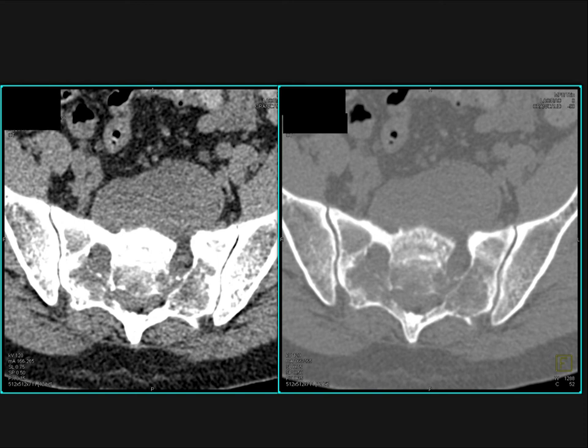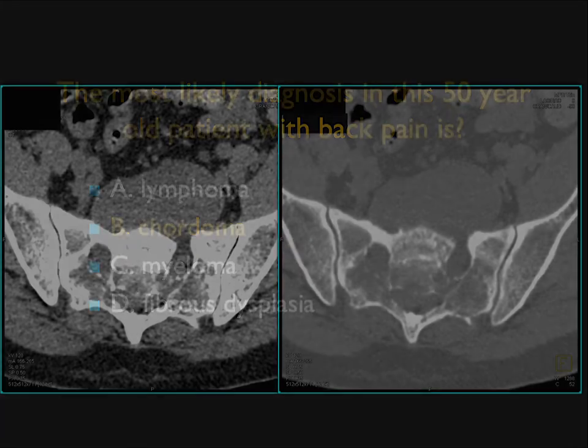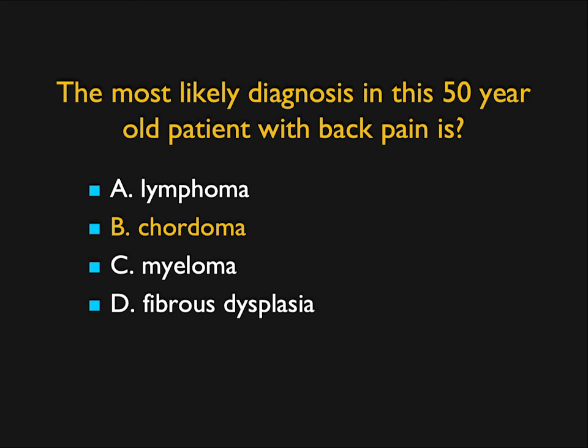Could this be a soft tissue sarcoma in front of the spine pushing in? Theoretically, yes, but unlikely. Sometimes you see rectal cancer growing upward, but that's markedly irregular. And this is very smooth. And this is a classic example of a chordoma. We don't see chordomas that frequently. Remember, this area, lumbar spine sacrum, as well as base of the skull, are the most common areas.